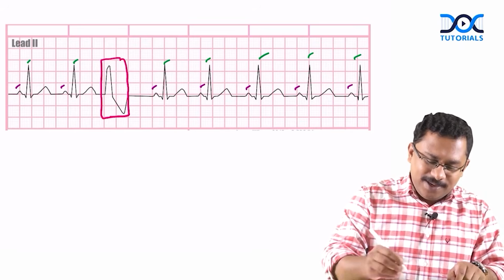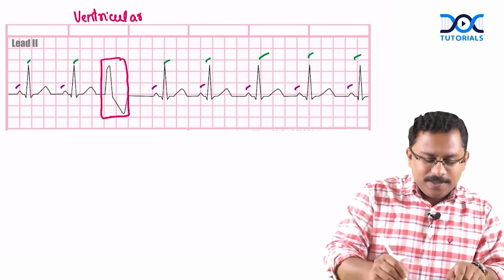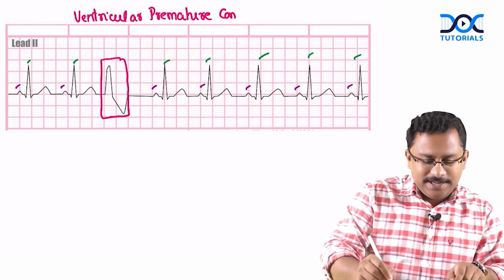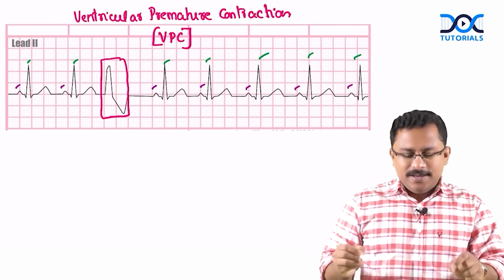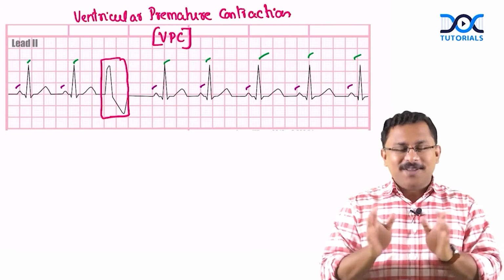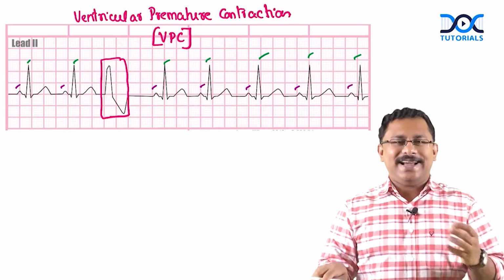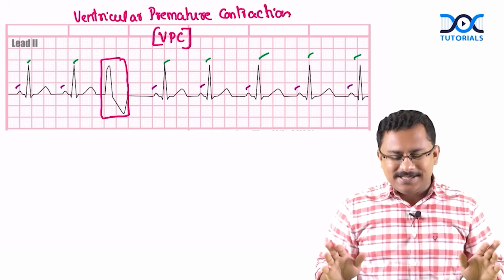This is nothing but a ventricular premature contraction, VPC. So you have the VPC here. This ventricular premature contraction, VPC, or you can even say PVC, premature ventricular contraction.